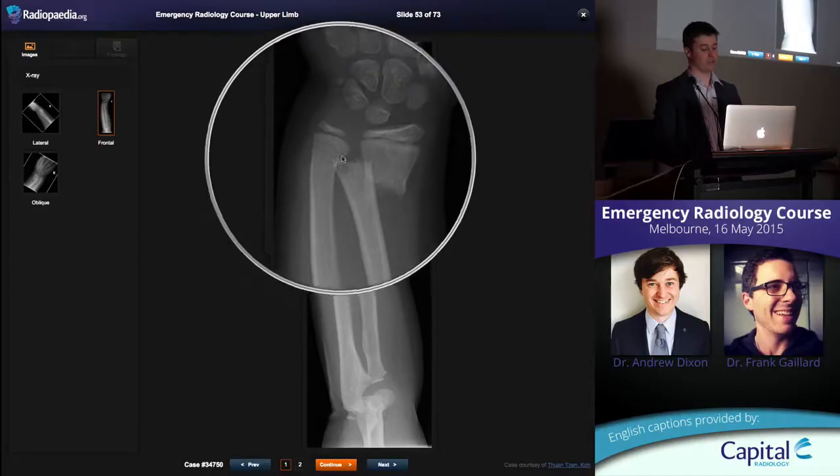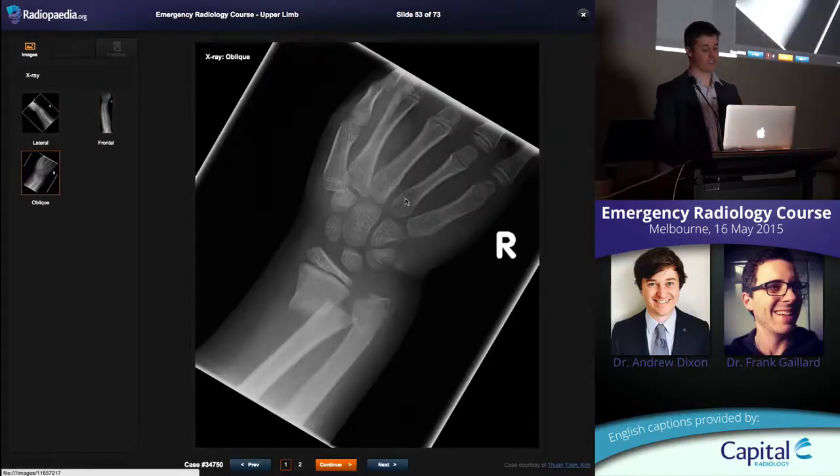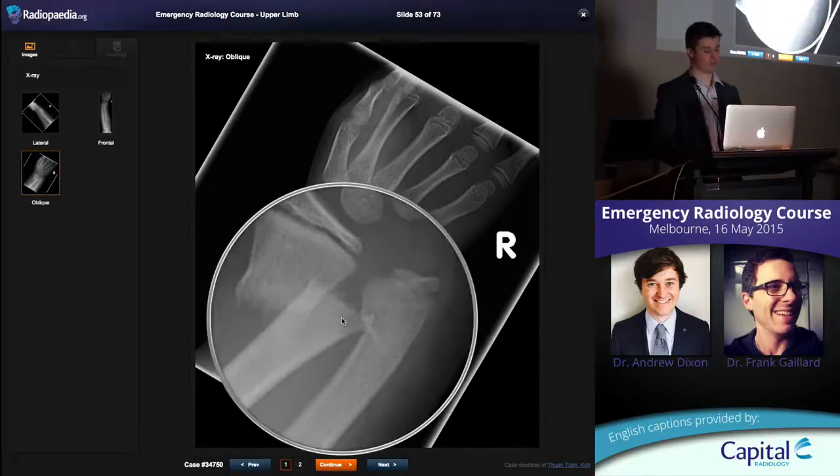and then there's a corresponding fracture of the ulna, which is a little bit bendy here. That's called a torus fracture. Can't quite see a fracture line. It's just done a little buckle. Okay, so torus fracture or buckle fracture of the ulna. Again, there's angulation. Angulation you would describe relative to the proximal portion. So this distal radius is angulated towards the radial aspect or laterally relative to that.